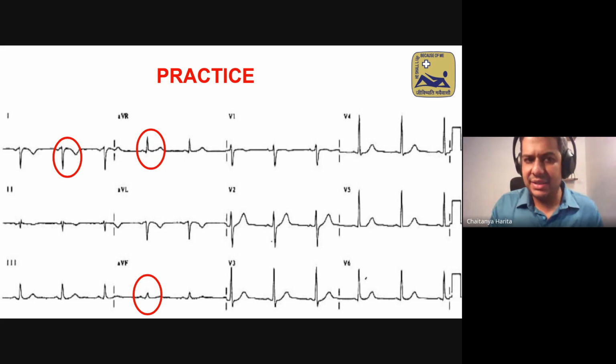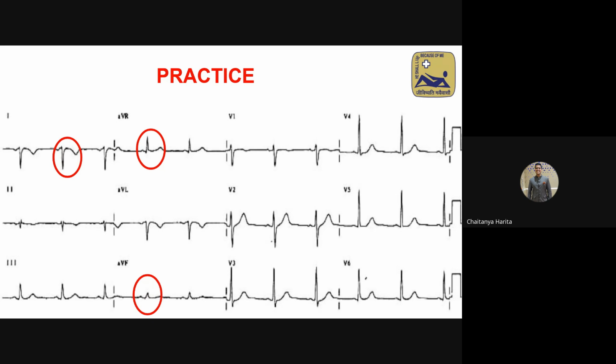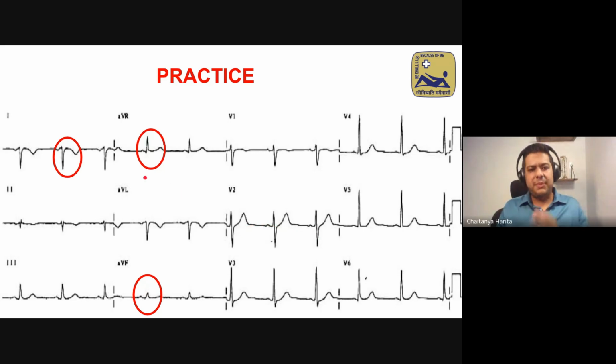This is to focus on the axis. Lead 1 negative, aVF positive, aVR positive. Can anybody unmute themselves and tell me what the diagnosis is? Dhwani, go ahead. Sir, wrong placement of leads. Why not dextrocardia, Dhwani? Sir, aVR is always negative. Yes, so here aVR is turned positive.